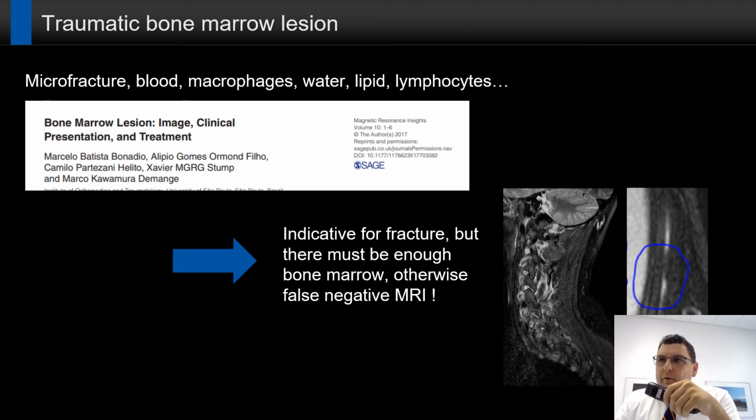In the past, I always recommended additional CT in spine injury, and well, after my Formula 1 race driver, I don't know what I should recommend in rib fractures if you don't see them. But anyway, I wanted to bring you this case to show you that this is not so easy sometimes to detect.